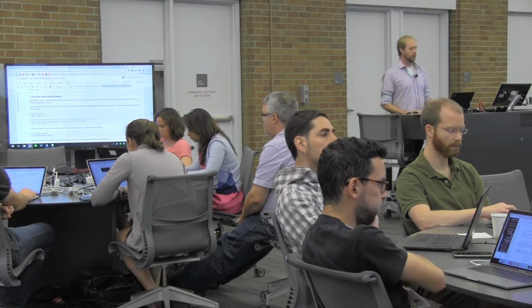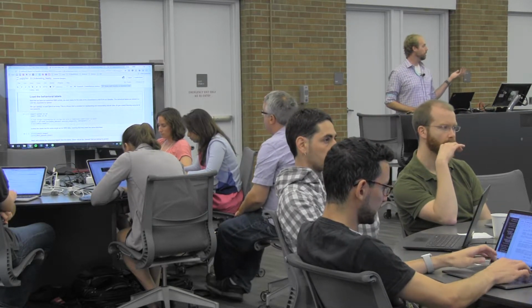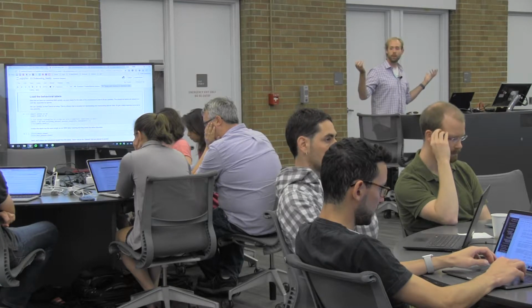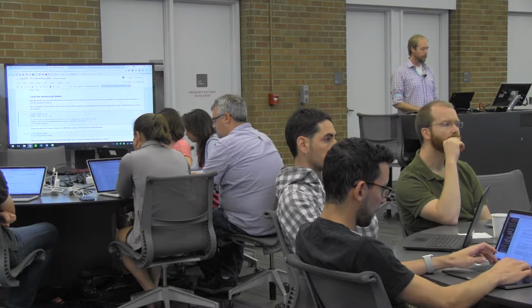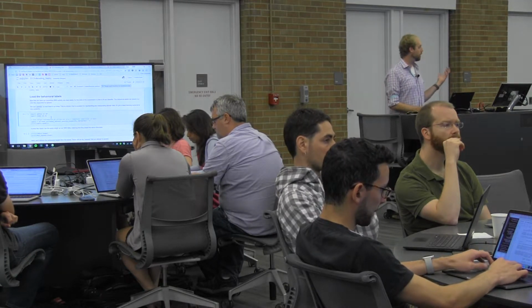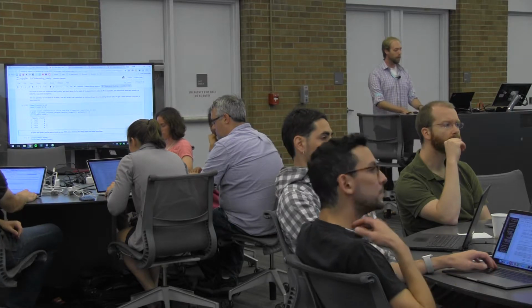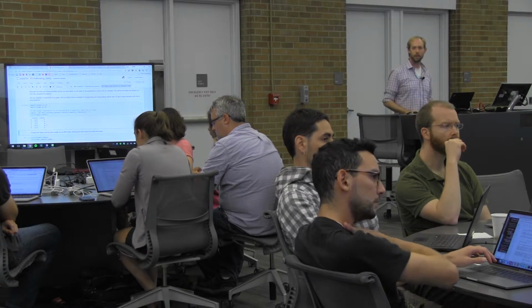Right there. So effectively, this is half of the equation. In order to do decoding, we both need information about the brain, but we also need information about the world. And that also has to be in a shape that Scikit-Learn can understand and play around with. So included with the Haxby dataset is a collection of metadata that says what kind of picture was presented for each one of these trials. We're going to use a library called Pandas to read that out. It's basically just in a text file with spaces that delimit the different characters that are there.